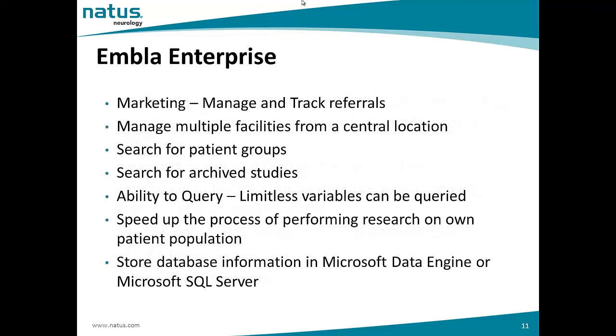For marketing purposes, you can track and manage the referrals. That means you would like to know how many sleep studies a particular doctor has been referring for the past 1 year, how many studies they have referred by month, and what kind of studies. With Enterprise, you can generate a report that gives you full detail of all this information. Let's say you have more than just one location or facility, for example 2 different facilities in 2 different locations. You can use Enterprise to manage these facilities.